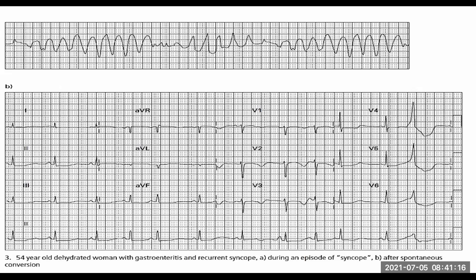So then you come in, you don't worry about this, because it looks strange, so you put it on the side. So you have a look at this first, and then you have a look at that, and then it tells you that maybe something is hypo over here. So everything comes back as hypo. And you say, okay, everything's coming back as hypo. And next thing, she has a syncope again, and then you see this. So that's your rhythm strip.